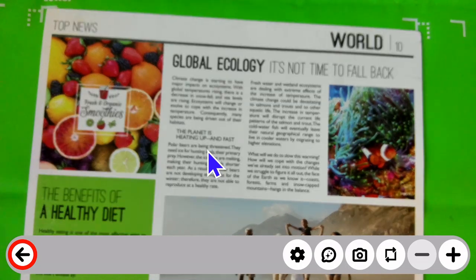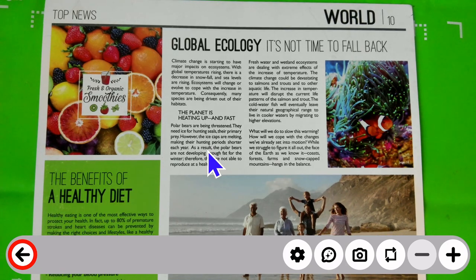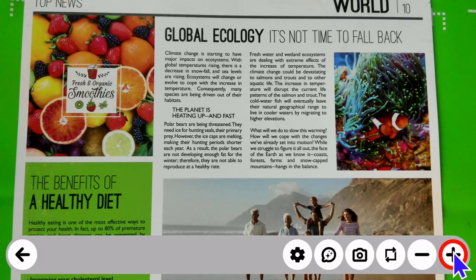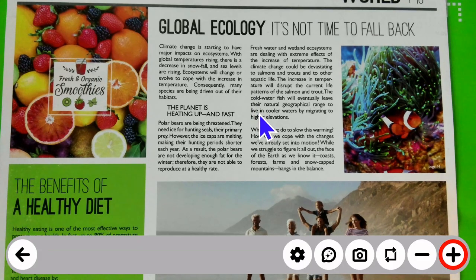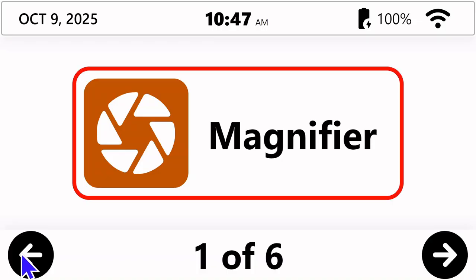And it's come online now and it's live. My magnifier is now working, and there we go. So I can begin to use, in the bottom right, zoom in and zoom out. On my screen, I can use pinch and zoom with a touch screen, and do other things like that. Check out the other videos to learn more about how to use the magnifier and other tools in Prodigy. But at this point, you're up and ready to go with your Prodigy software.